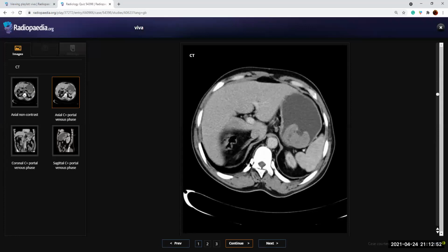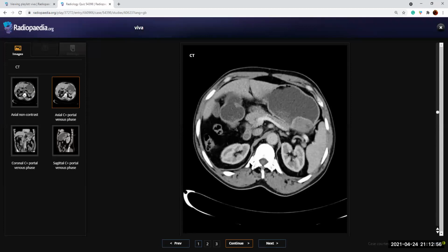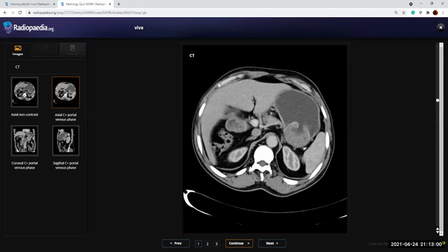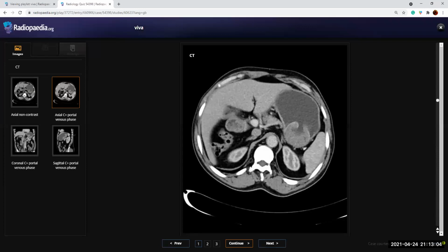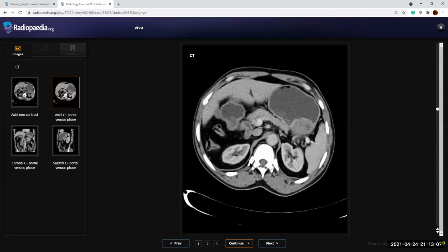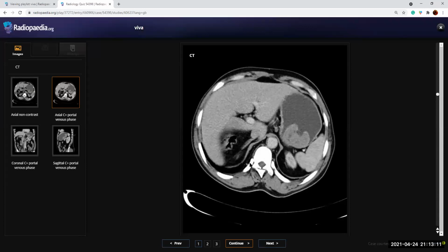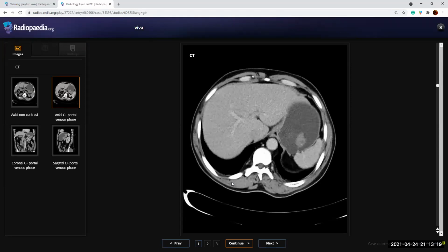We are anyways wrapping it up. Just look at the shape of the lesion. Yeah. It is a reniform shaped lesion with the... How would it ideally look like? It's an ulcerated lesion, actually. Okay, so it could be a source of bleeding. So okay, this could be leiomyosarcoma then. It could be a plain GIST. These GISTs and leiomyomas can ulcerate.